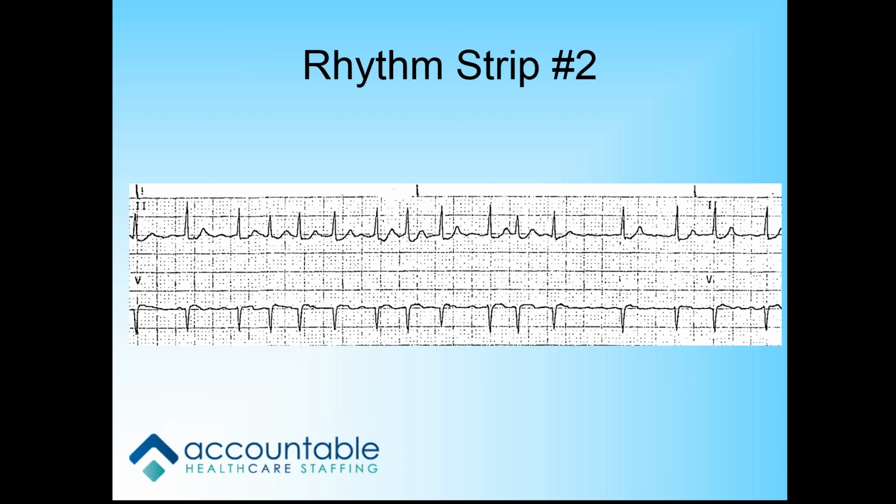Good. So a golden rule of thumb with AFib: anytime you have an irregular rate rhythm and you're trying to argue a case for whether you have a P wave or not, you're in AFib. Guaranteed every time. Okay, next. There you go, AFib. Good job.